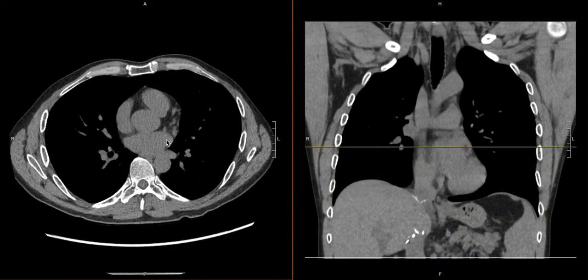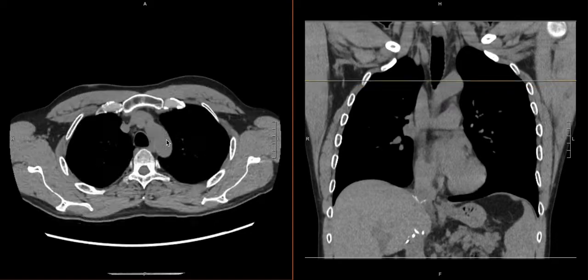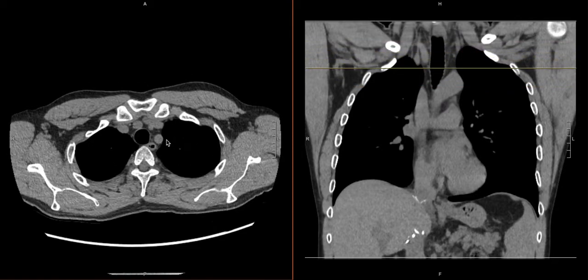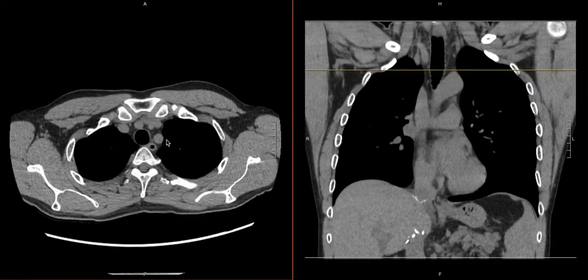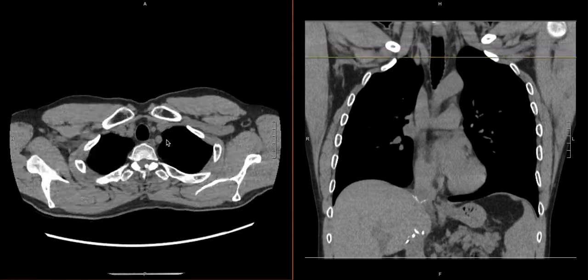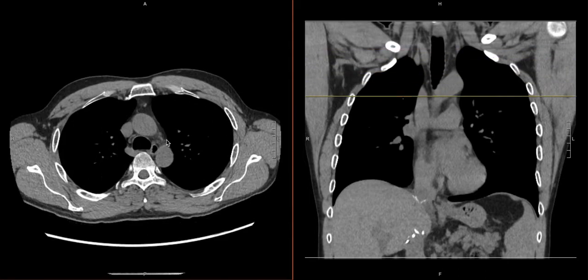And this can be either a small or very small part of your search pattern as you're scanning through a CT scan of the chest. Because in some cases it may be useful to be aware of where the veins are on a non-contrast study, and you may be able to see some obvious pathology that you may be the only person to catch on a non-contrast study.